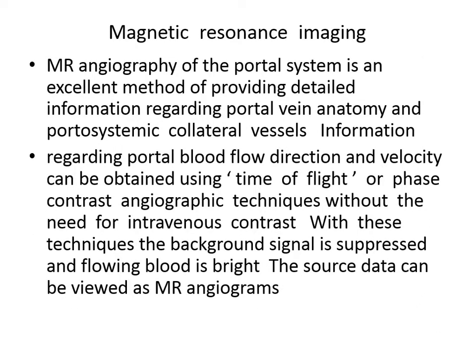Magnetic resonance of the portal vein. MR angiography of the portal system is an excellent method of providing detailed information regarding portal vein anatomy and portosystemic collateral vessels. Regarding the portal blood flow, direction and velocity can be obtained using the time of flight or phase contrast angiographic techniques without the need for intravenous contrast.